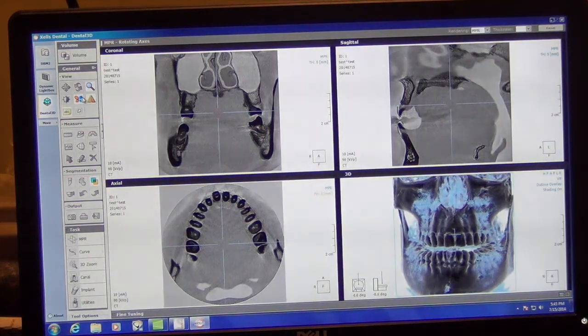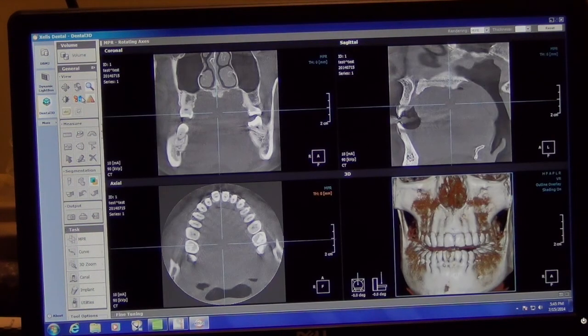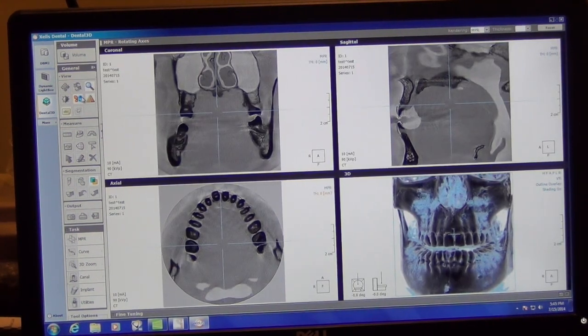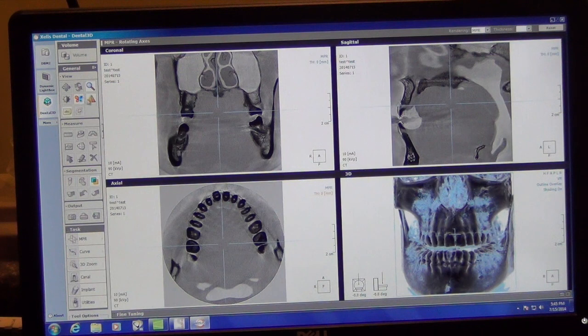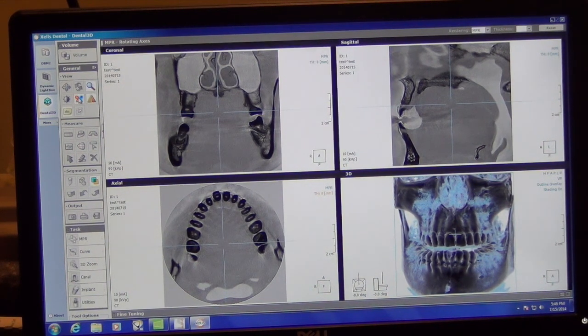If there is some particular anatomy or canal or something that you might not be able to see in its normal view, sometimes toggling this off and on can give you a little bit of a different perspective to actually get a little bit more out of the image at times. Right. Say in the sinus area, maybe a canal, you can see a little bit more anatomy pop out than you might in its normal view.